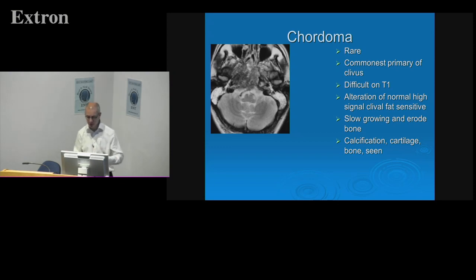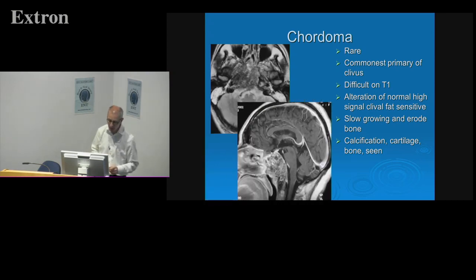I've got a friend who works in Leeds now, who says fat's your friend when you're a radiologist, and it's true. On CT and MR, it's very useful to look for the signal from fat and see if it's clean. You do see calcification, but it's a very heterogeneous appearance, and that's mirrored in this patchy post-contrast enhancement. You can see it's quite expansile, this one.